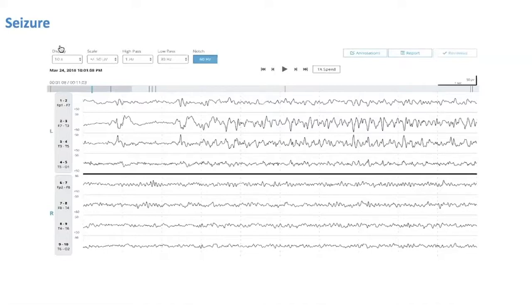As a seizure begins, a focal seizure in particular, one loses that correction. It becomes a sequence of discharges. And so it becomes a rhythm of clean, well-formed spikes or sharp waves at one location that end up picking up and spreading. And maybe it's the loss of the slow wave which allows for this to happen. Would you call this an evolution? Yes, evolution is a commonly used term for it.